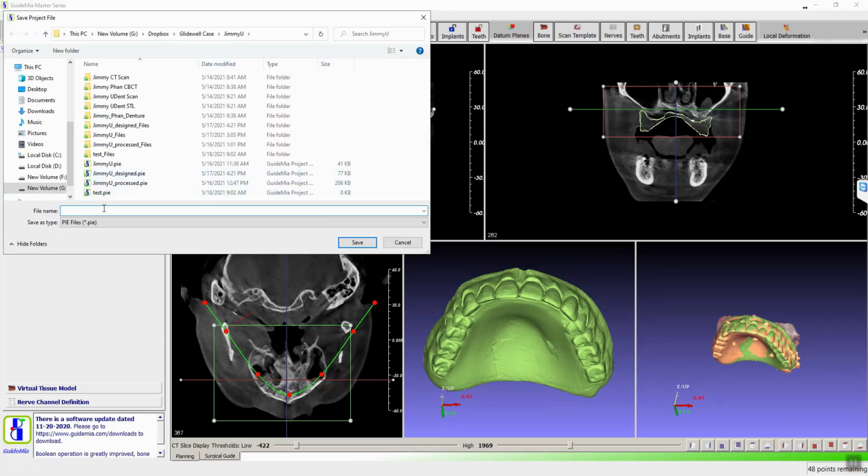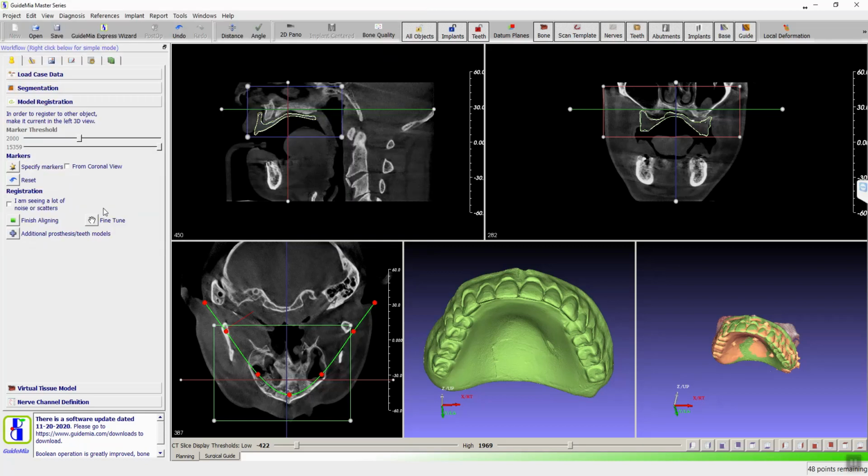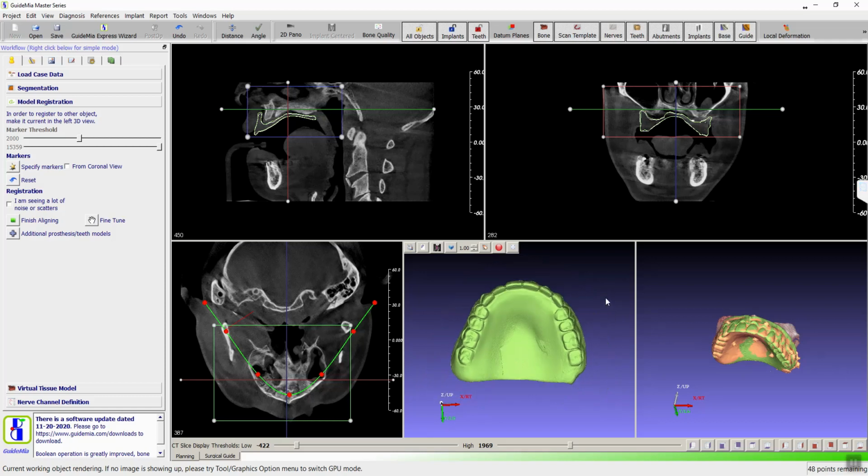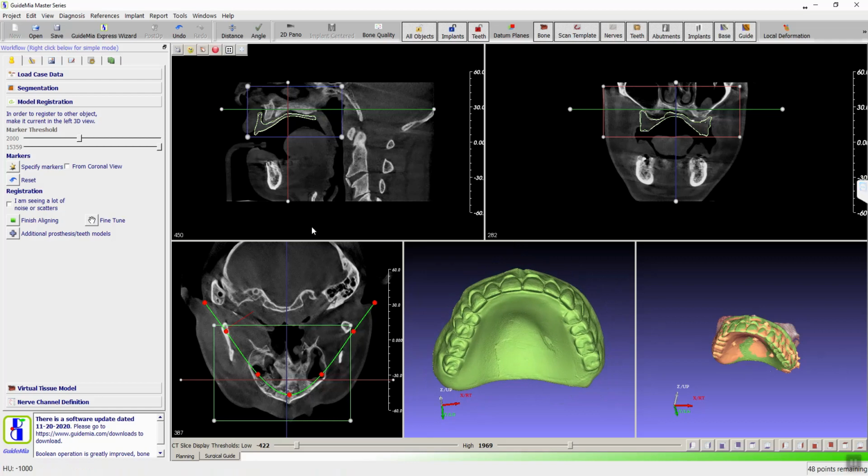that. So as long as this STL file has a good quality, it doesn't have multiple shells, holes, those kind of things, we can use this one for full arch guide. No problem. Yeah, that's awesome. So at this moment, if we move on, this is the radiographic guide, not the first guide. So everything can be done with this. Now let's place implant.